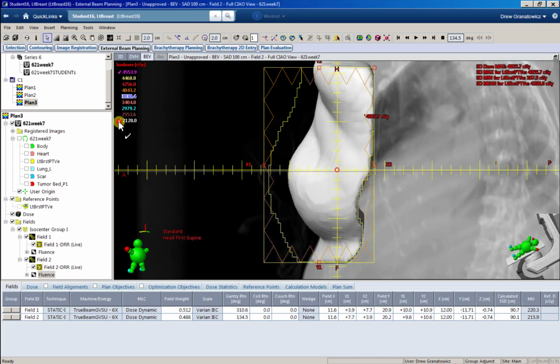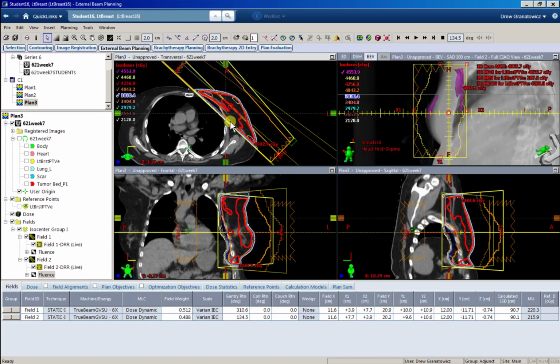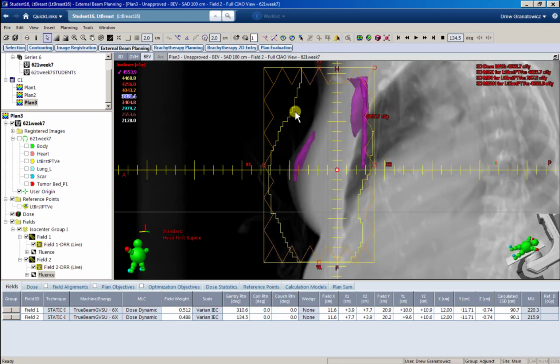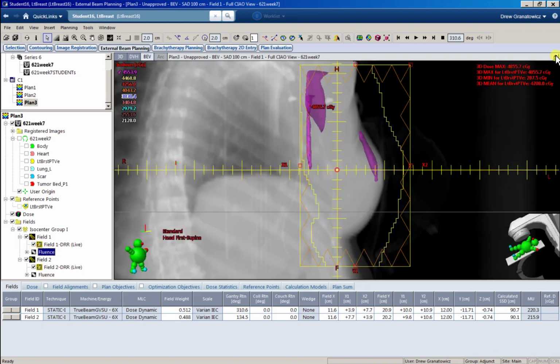Okay, so we've calculated our dose. You should always double check that you properly recreated that block edge. So in this case, we were blocking out the heart. Just double check. So when you look at your image now, your beam's eye view, you should see that block edge reappear and you can see your flash. Just confirm that everything looks good.